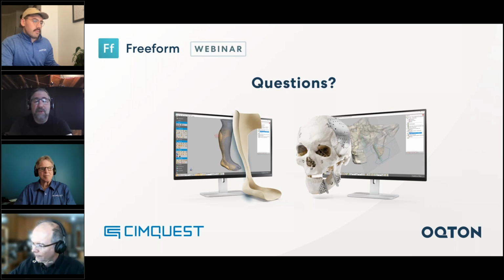It resamples your surface, and that gives you the ability to basically see that you have a fully closed watertight model. The voxel tools work with our sculpting tools, so that's one of the reasons why we separate the two representations in Freeform. When you're carving, and many of our pattern generation tools in that nature, will work only on clay.